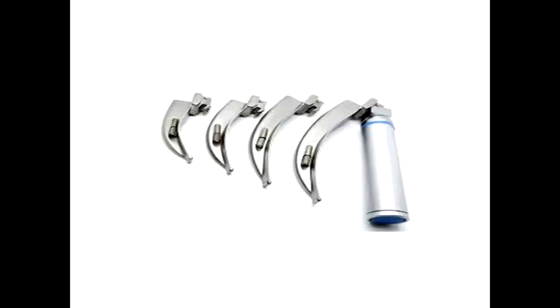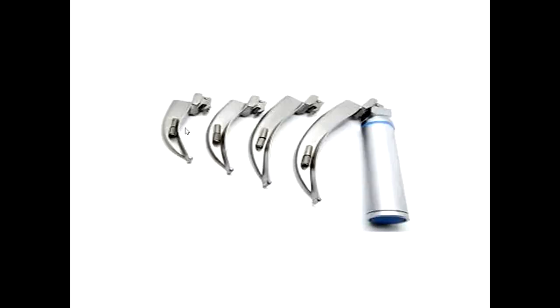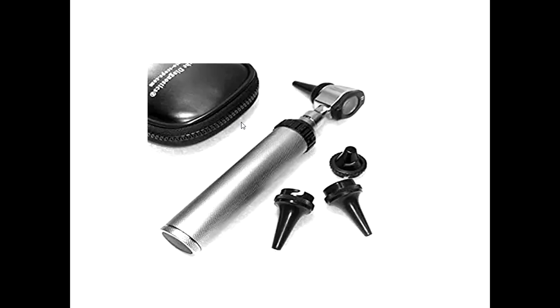This is a laryngoscope and different sizes of blades. And clinical uses are for visualization of upper airway, and another clinical use is for endotracheal intubation and suction.